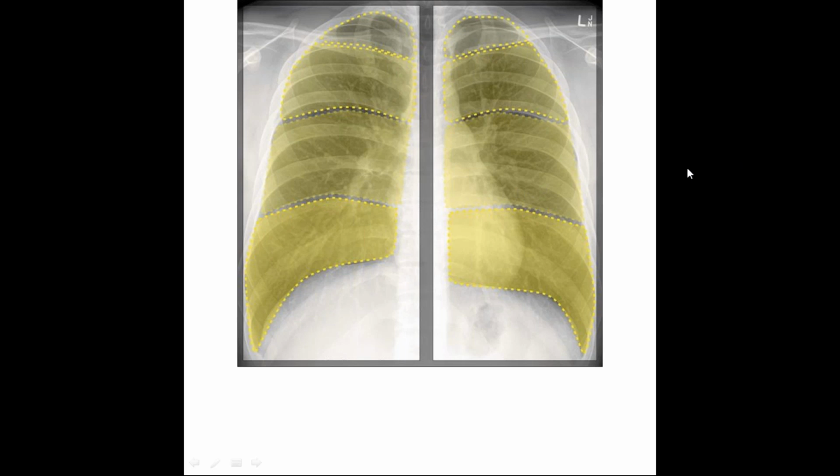Okay. So the extent of the middle zone is again 2 to 3 ribs. If I'm saying the upper is the first 2 or first 3 ribs, the next would be another 3 ribs, and the last one would be the last 3 ribs. So it is 3 to 6, 6 to 9, like that.